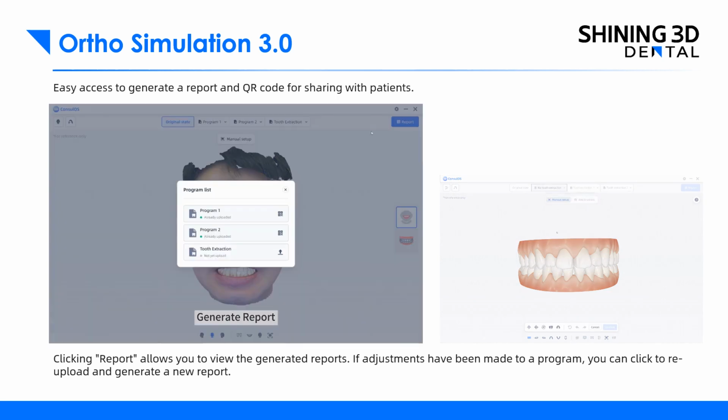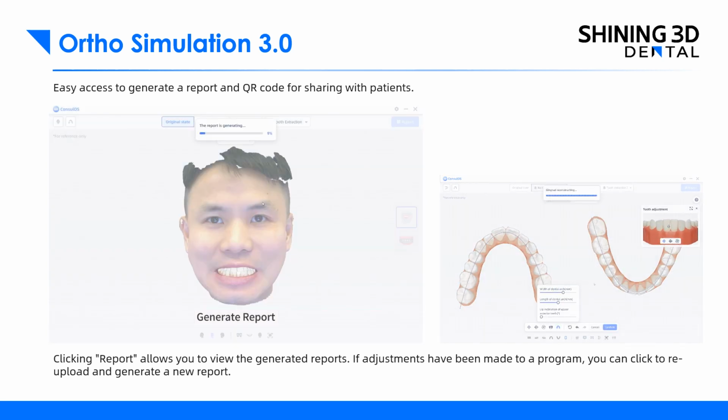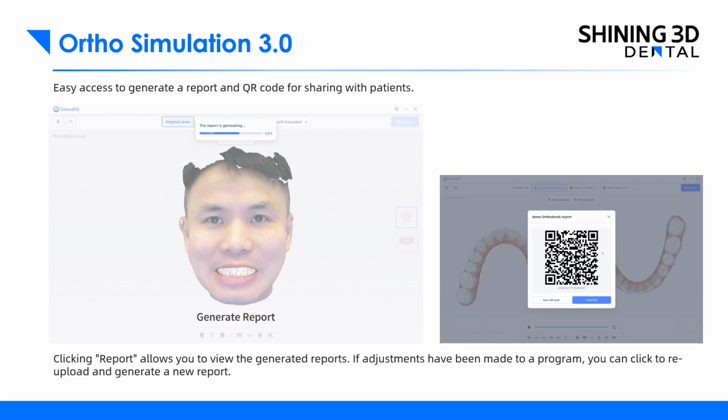The Ortho Simulation 3.0, compared to the old version, has easy access to generate a report and the QR code that you can share with the patients. As you can see from this slide, after you click the button on the upper right side of the interface, the software will generate a report that contains all the Ortho Simulation data that you have already seen in this module.